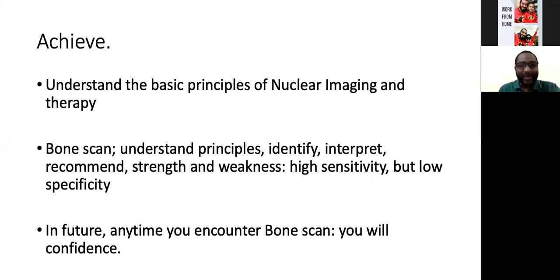I also want you to have confidence in interpreting bone scans anytime you see one, and that you should not panic, particularly in exams. It's very easy. Once you follow the methodology and you are consistent with it, you realize that bone scintigraphy is probably one of the simplest imaging modalities to interpret.